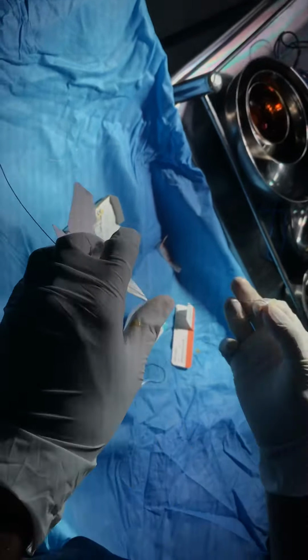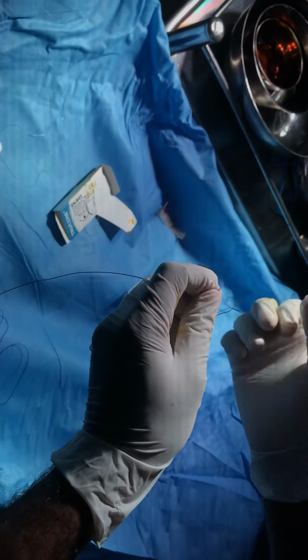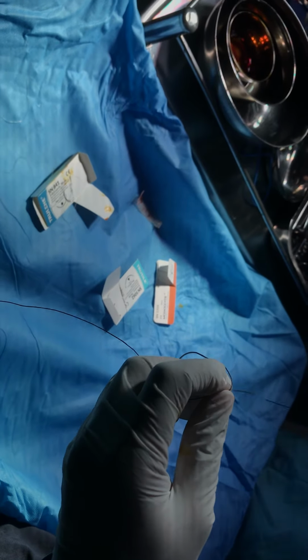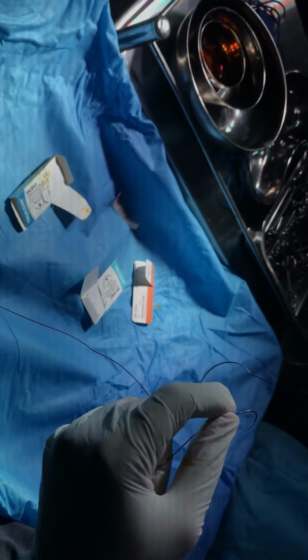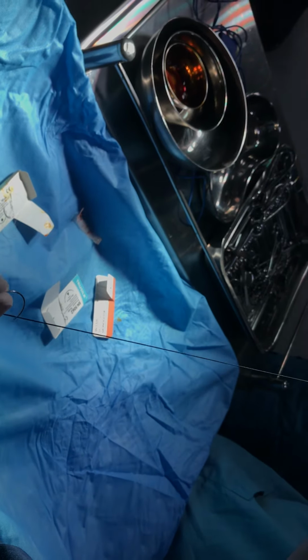You can see multiple filaments are there, so it also looks like silk. But the difference is that braided silks are usually non-absorbable. There are some other silks which are directly made from silk worm, and some of them are absorbable, but what we are getting nowadays is non-absorbable suture material.